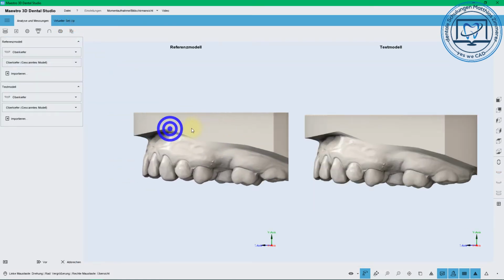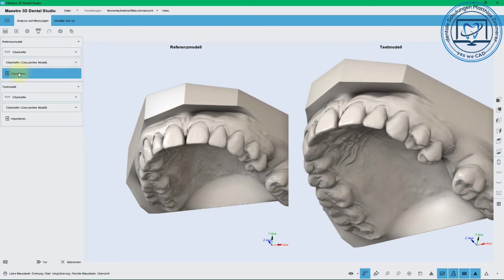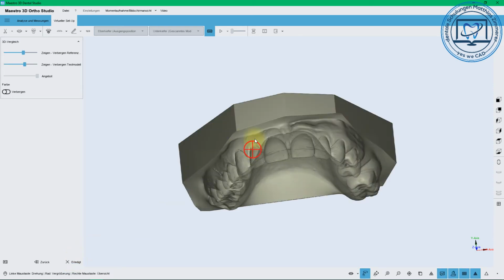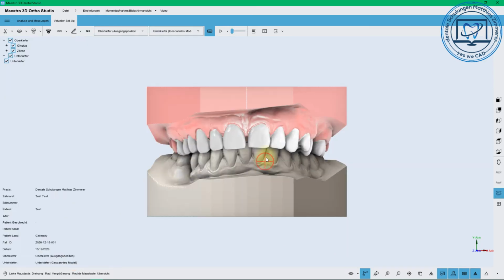This is nothing new. We are using it in ortho, Düsseldorfer values, it's called in Germany. And we are finished. Here you also have the possibility to load an old model, and so you can have a view on what's happened and where we have to go.